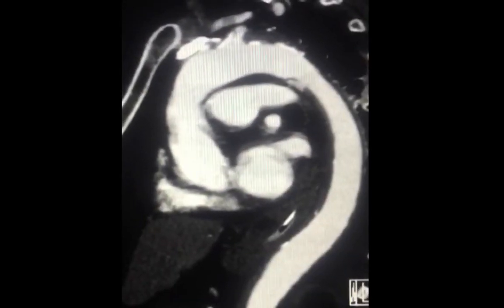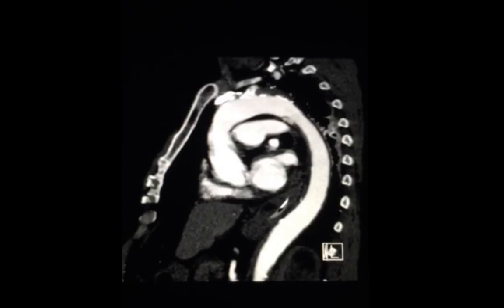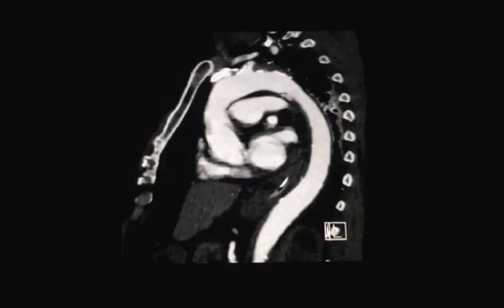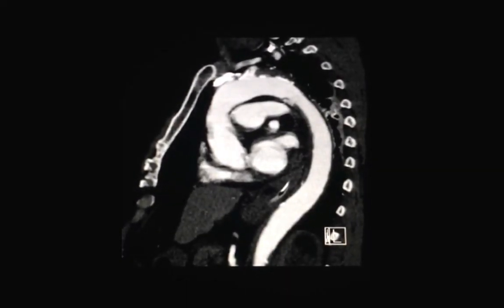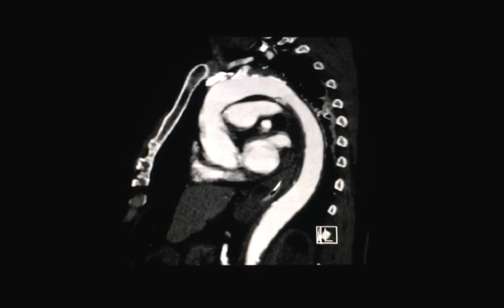So what have we learned from this single sagittal contrast-enhanced CT aortic angiogram? We learned a bit about the types of traumatic versus non-traumatic aortic injuries. We touched on aortic dissection, knowing that it's related to hypertension, non-traumatic, and has two types. We talked about the common locations of aortic injuries in trauma and discovered that aortic root injury is very common and patients unfortunately die at the site of the accident.